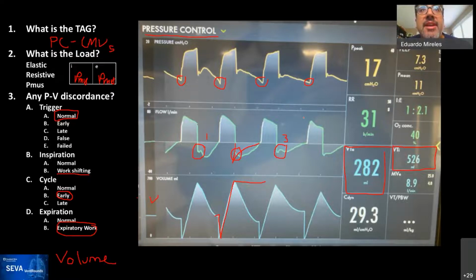It should, right? If this is a patient that is breathing faster and he starts air trapping, at some moment the total lung capacity is met, and you cannot expand the lung anymore. If this was a patient that is breathing fast, you can see that, that's why when they tell me that this is auto PEEP, in general, when you see this amount of air trapping, you would expect that the patient's tidal volume would start going down as time goes forward.